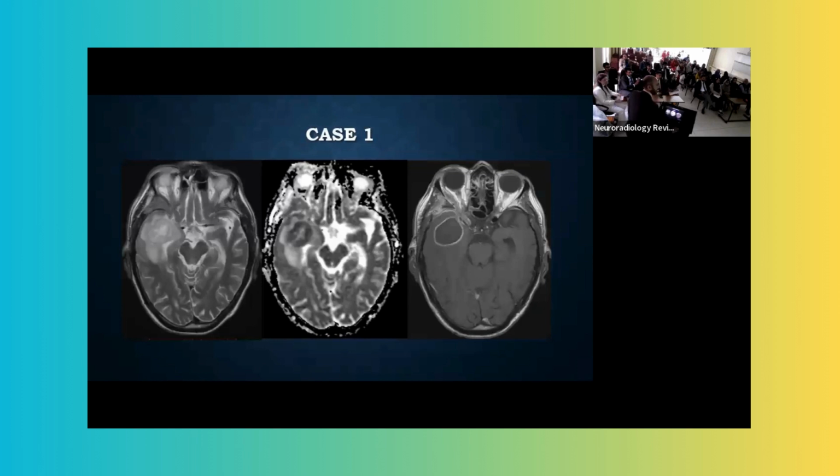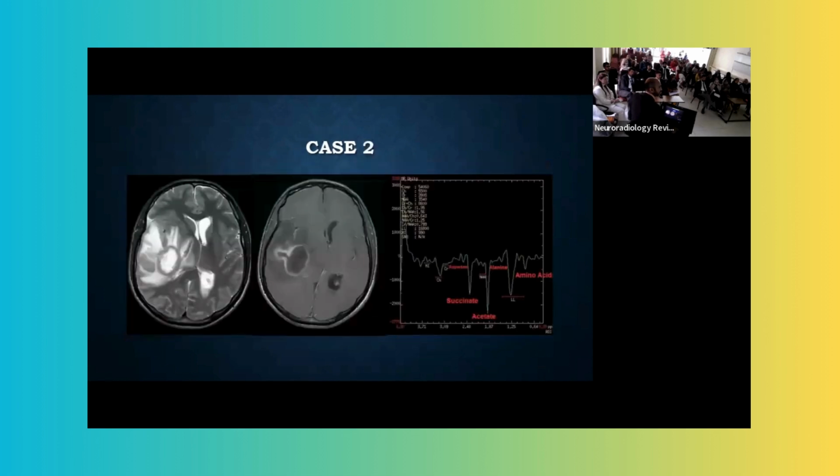As you can see, this shows a well-defined mass with extensive surrounding edema. We've got central restricted diffusion, and we have peripheral post-contrast enhancement. And there's a clue here where the infection is arising. Has anybody guessed where the infection is coming from? This is coming from skull base osteomyelitis, as you can see around the right orbit. That's one of the ways, and we need to be vigilant to look for these findings when we look at these cases. So this is a very important case also.